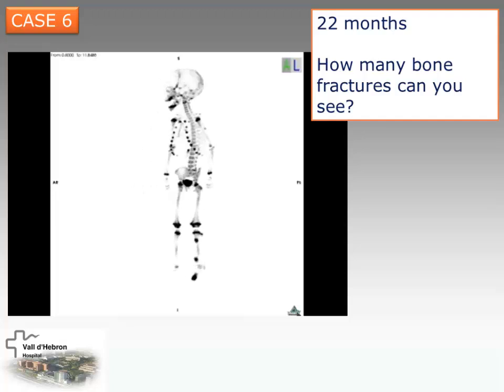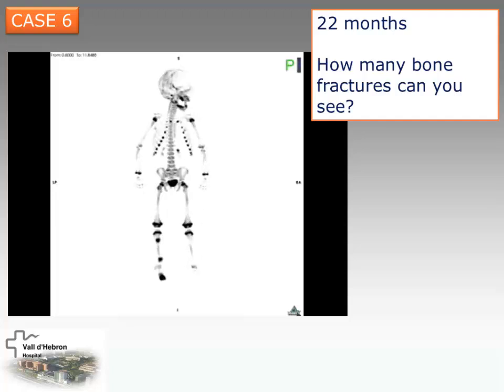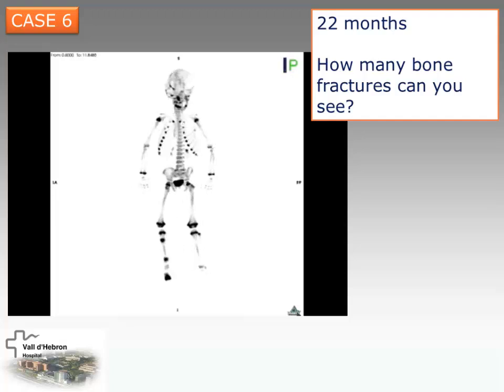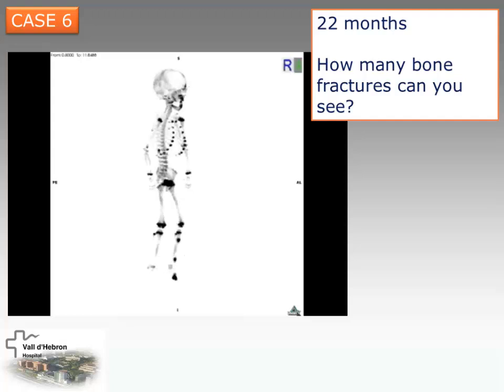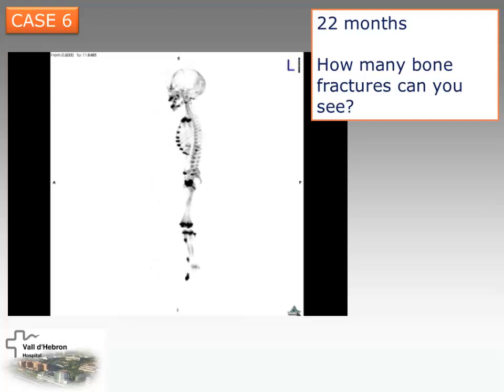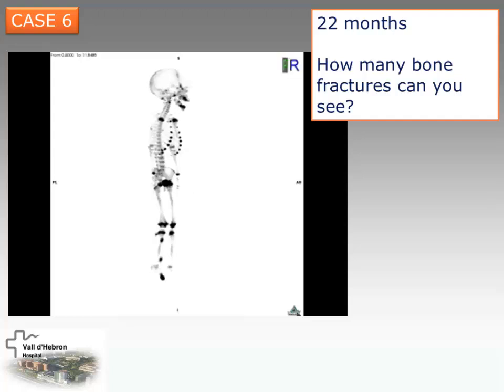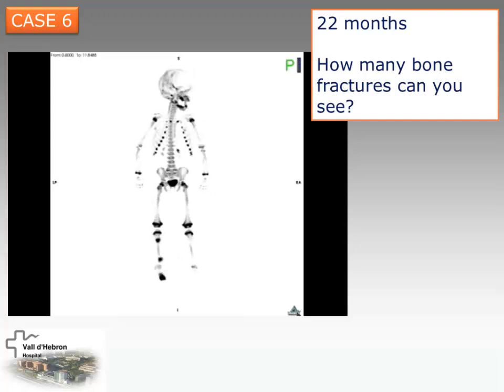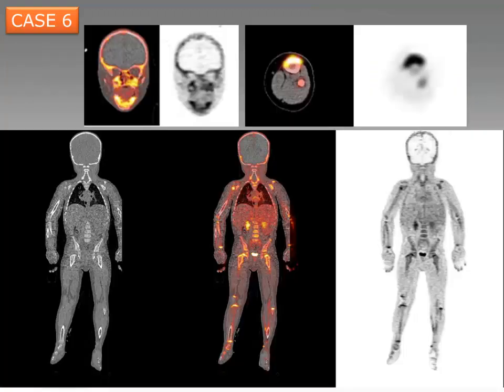Okay. And what about the maxillary and the mandibular? Is it a normal uptake? No. And what about some cervical vertebra? Also. And then we can go here.